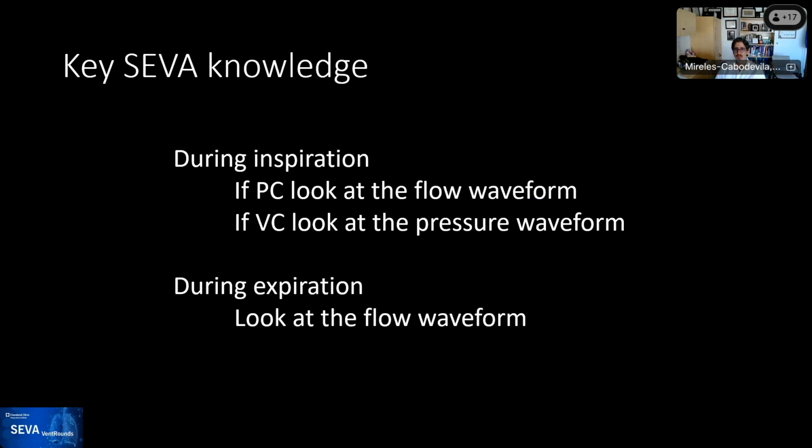And if it's volume control, then look at the pressure waveform. This is key. That's where your eyes should look. And then during expiration, in the expiratory phase, look at the flow waveform. And the reason is because we're controlling the pressure. So your eyes should go and look at the flow.